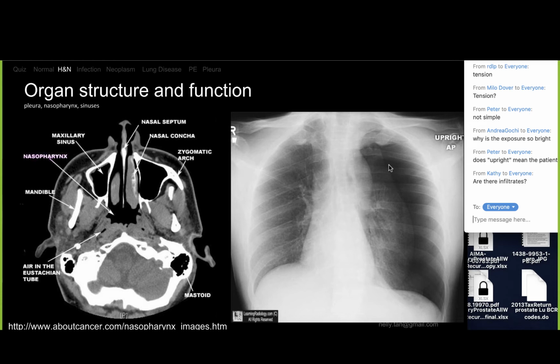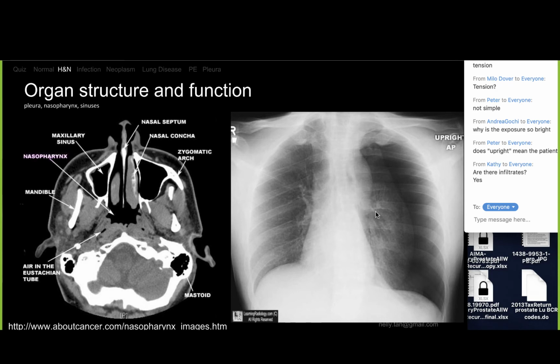So Kathy has a question. Are there infiltrates? Where? Here in the left lung? Like over here, you mean? Yes. So great observation. Oh my gosh, I swear your class is full of people who, if you all go into radiology, would do superbly.